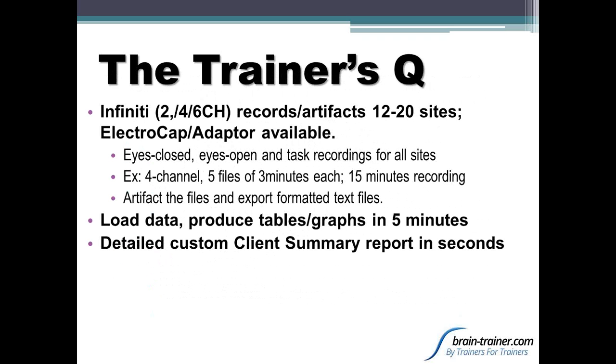But the cool thing, it actually grew out of an earlier presentation that I did on the TLC Suite for Infinity users. Had several people who said, you know, what would be really great would be if it would give us a written report about what's in this brain. So as you'll see in a little bit, the TLC7 does that literally in a matter of a couple of seconds. It will give you a 5 or 6 page written report that summarizes, organizes the different ways of looking at the brain, different areas of looking at it, and then identifies for this client which ones are present and which symptoms are likely to be related to those.